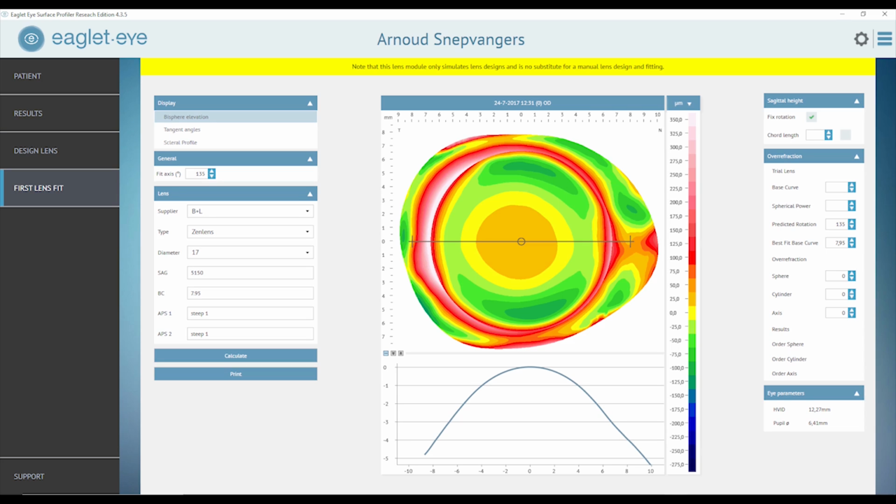And here we see on the bottom the APS-1 and APS-2. APS is the name that Bausch is using to name their landing zone. So our algorithms always follow the naming system given by the lab, and behind that you will find a number.